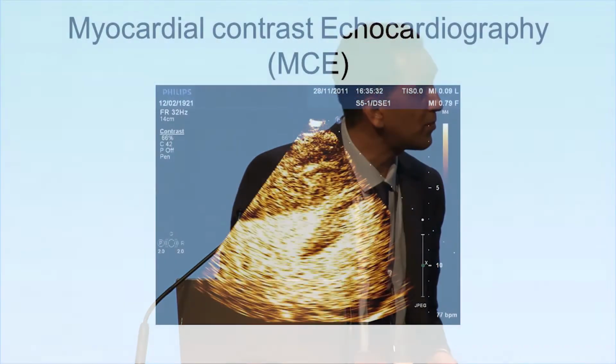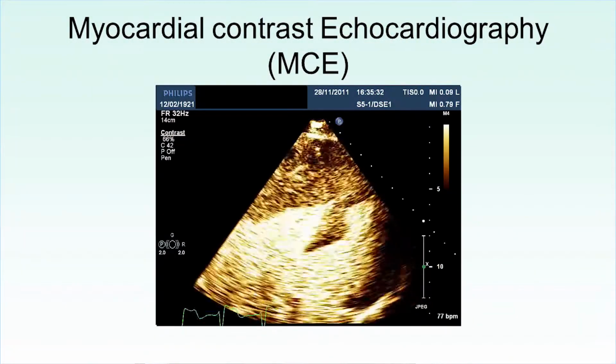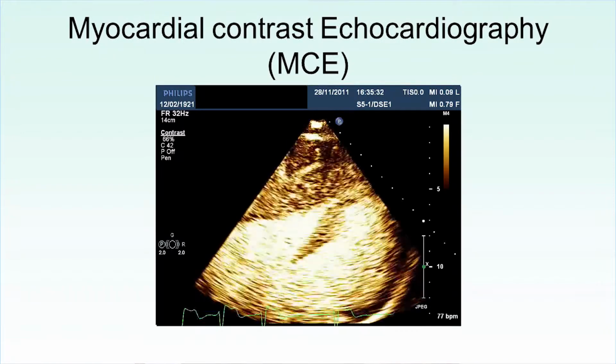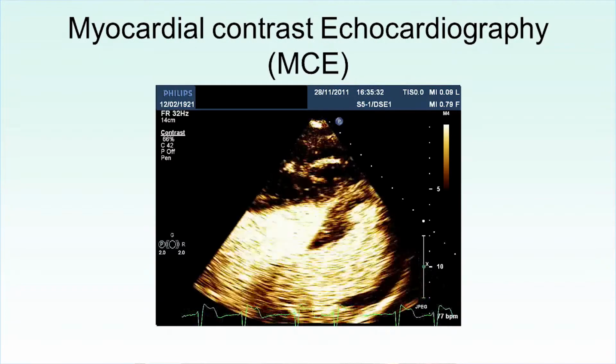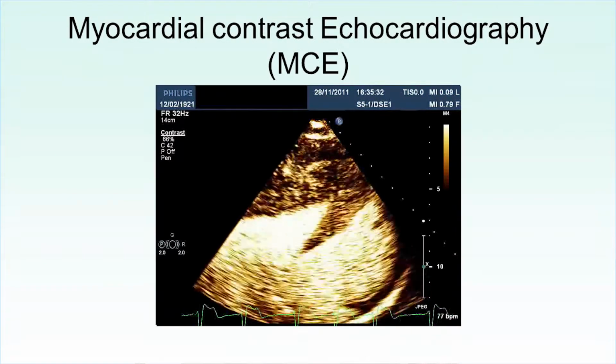Also, the next aspect is myocardial perfusion imaging, which we utilize sometimes, and again, it's at the research level. The key thing for this is showing perfusion. If you look at this, you can see a flash which takes place here. Here it goes. So just wait, there it is. You can see perfusion taking place beautifully. So we know perfusion does take place when you utilize this type of technique.